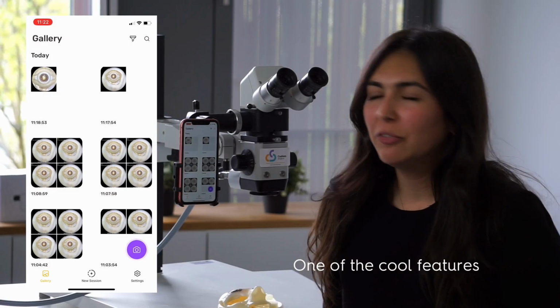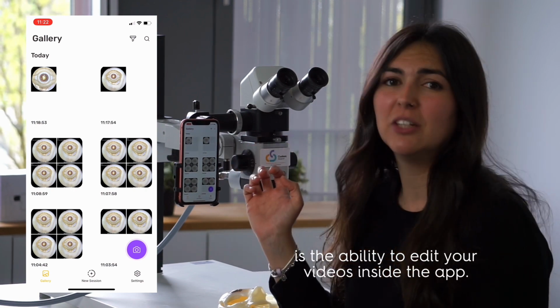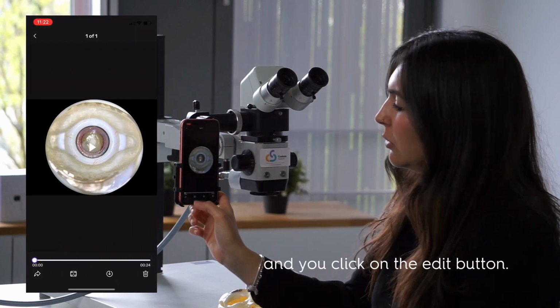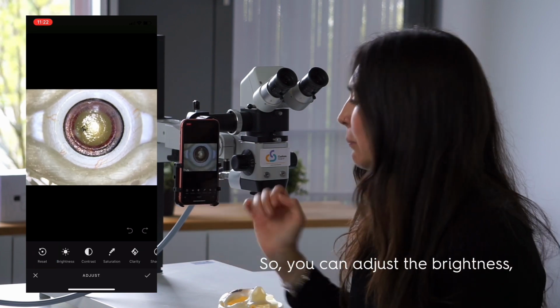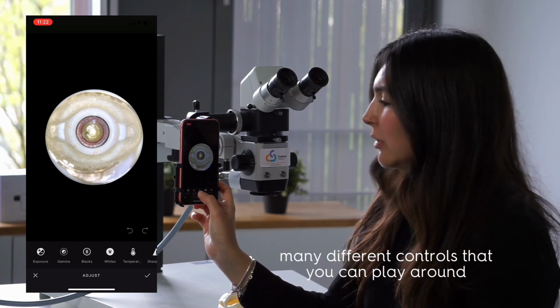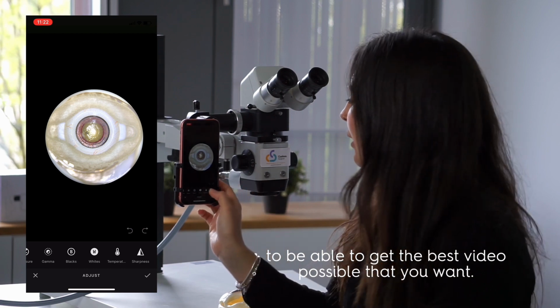One of the cool features we have introduced in the MicroREC App Pro is the ability to edit your videos inside the app. So basically if you go here, you click on your video and you click on the edit button, there are many different things you can do right now. You can adjust the brightness, the contrast, the saturation. Basically, you have many different controls that you can play around with to be able to get the best video possible.